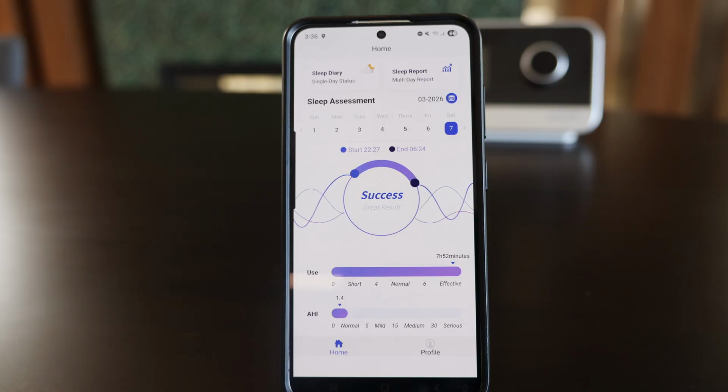So in this video, we're going to cover the SmartSleep app and how comprehensive it is. Now this works with any SmartMed device, whether it be the Wi-Fi version of the iDisc, of the iBreeze, or of the brand new iBreeze Gen 2. When you first log into the app after you've set up your account and your Wi-Fi, this is the main dashboard that you see. The reason it's so comprehensive is because of the different layers of data that you can see, which is quite unique compared to most CPAP machine apps, which just give you very basic summary data.